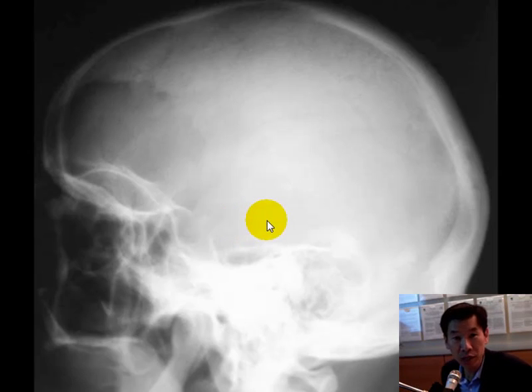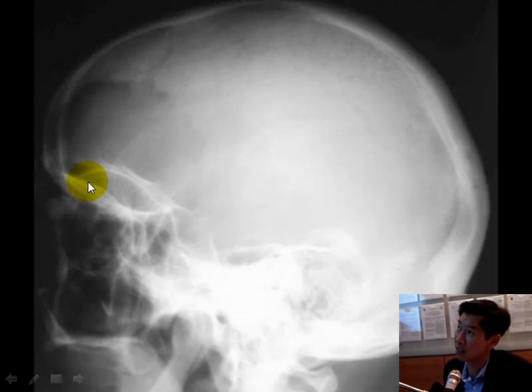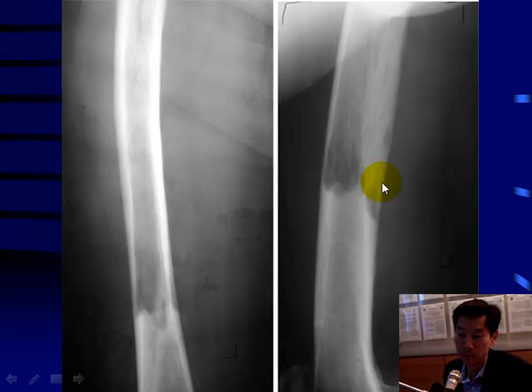You may say, well, how do we distinguish this from metastasis or from multiple myeloma? Well, unlike those other two diseases, this is quite commonly a single lesion, a single very large lesion, and the patients will actually do very well down the line from this lesion. We'll see some follow-up in just a second. Whereas generally with metastasis and multiple myeloma, there are multiple lesions and usually smaller.